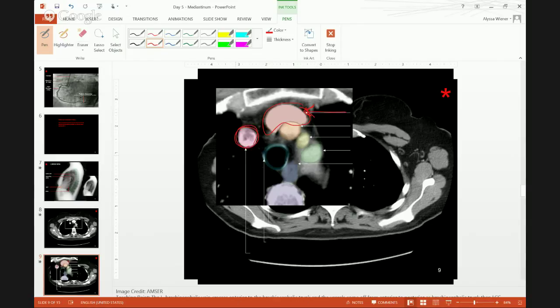Over here is maybe where we'd normally see the superior vena cava if we were lower down in the chest, but since we are up high, this is going to be our right brachiocephalic vein, okay? So here we have our right and our left brachiocephalic veins. If we go lower, they're going to merge to become the superior vena cava. Okay, so then we have these three little guys that are posterior to our left brachiocephalic vein. Can we try and think what these might possibly be?